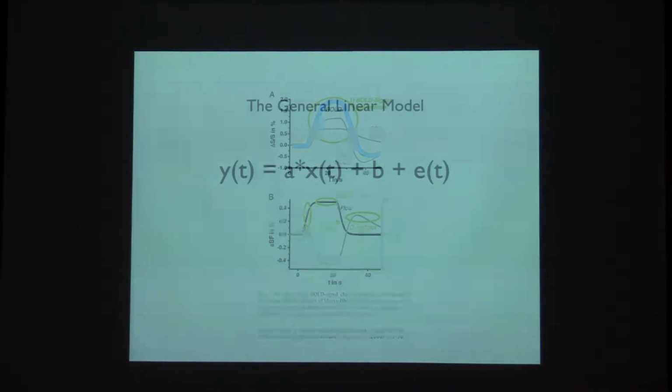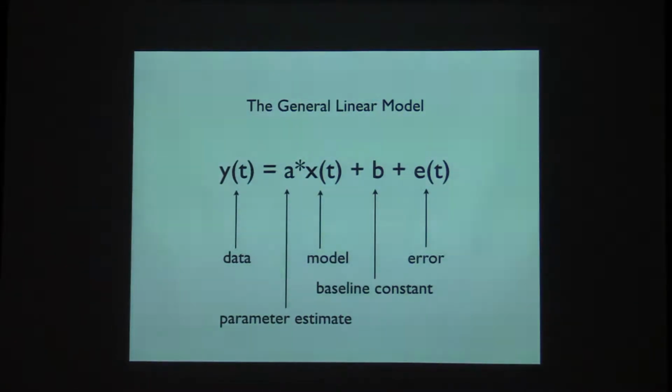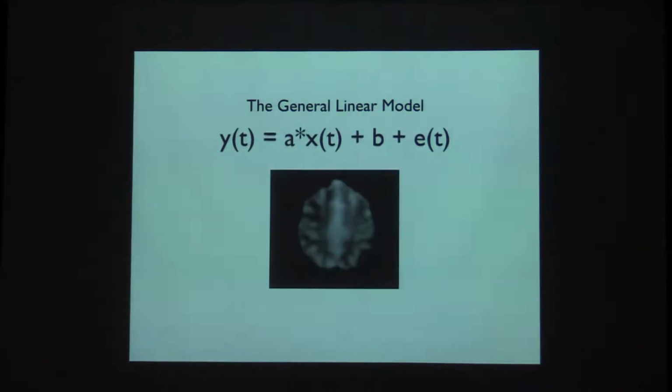Okay? So after that, now we got to go back to math. No? Okay, no. I will make this super simple. All these fancy terms you don't need to know. All you really need to know is that when you look at an fMRI experiment in real time, do you see the gray flickering? No? So I can zoom it, yeah?